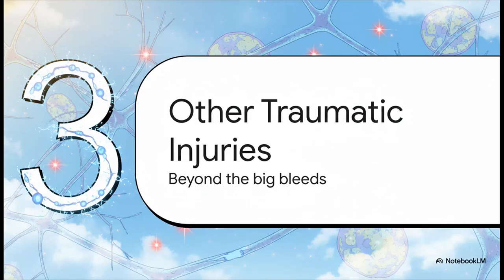But head trauma isn't just epidural and subdural bleeds. There's more to the story. Let's widen our lens a bit and look at some other important injury patterns that can happen.